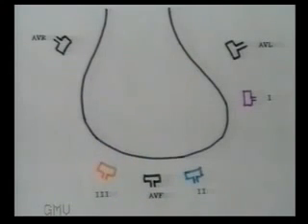This diagram now shows how the 6 different limb leads look at the heart from 6 different directions. Leads 1 and AVL from the left side, leads 2, 3 and AVF from the inferior side, and lead AVR from the right side.